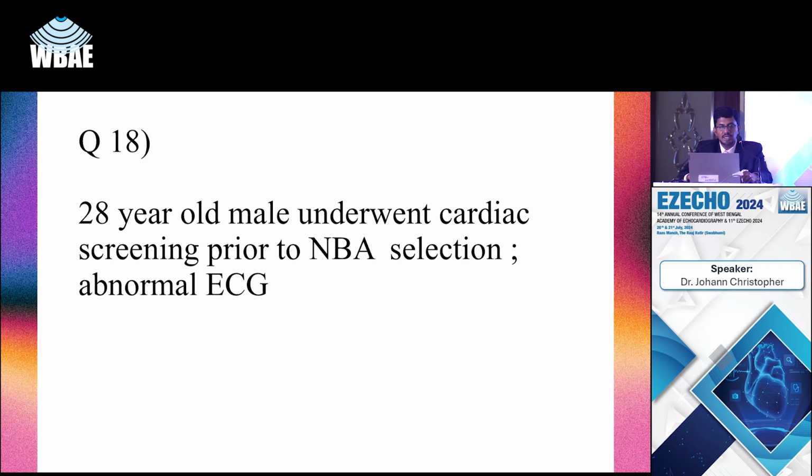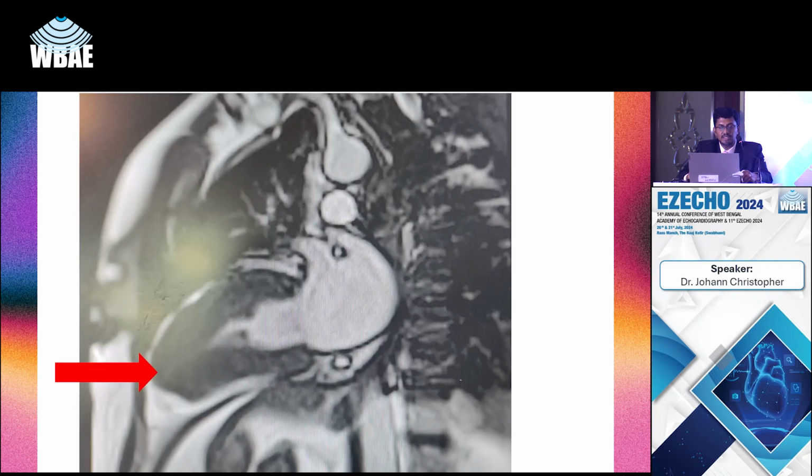First choice, is it a CTA showing fresh thrombus? Second, is it CMR with ischemic heart disease and an old thrombus? And C, is it CMR with ischemic heart disease and a recent thrombus? Here, I would like to mention that there is a possible IMH also. Possible IMH for question number C. So you can just note that IMH is part of this answer. And D is a DCM with a recent thrombus.